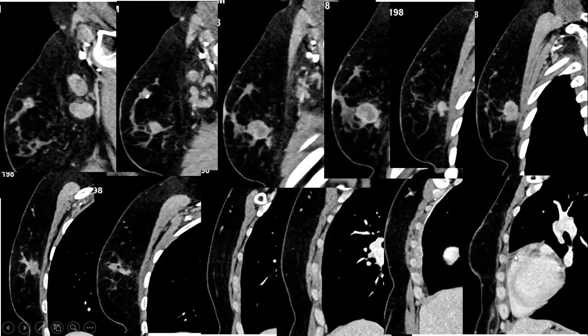And if you go even here from the left side, this is the intercostal on the left side. When you come to the right side, look for this focal thickening and enhancement, signifying what? There is chest wall involvement. Not only the pectoralis is involved, but also there is adjacent chest wall involvement.